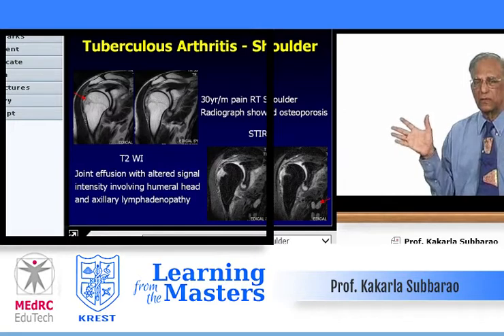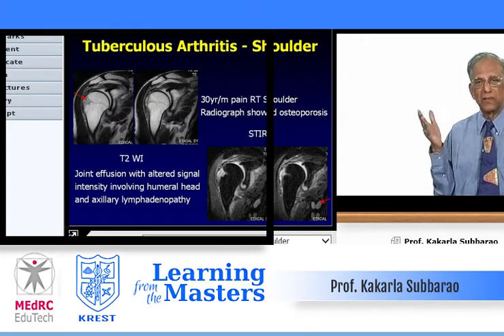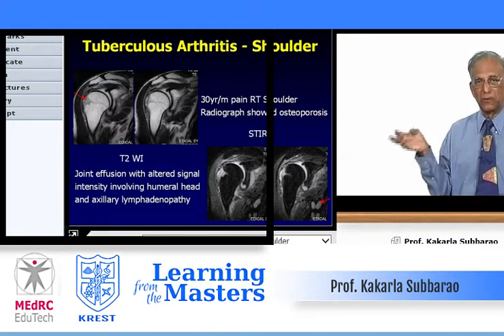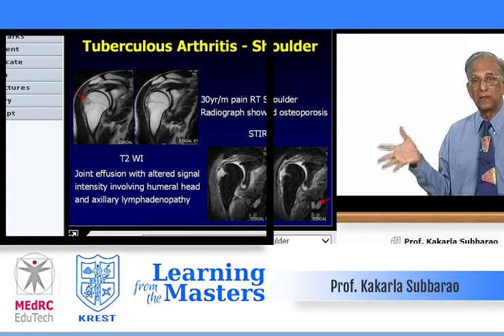Can you diagnose this by ultrasonography? Yes, probably yes, at least suspect. CT doesn't show the nodes, and you can't really identify the effusion. The MRI clearly tells us what is synovial hypertrophy, what is bone erosion, and what is effusion, and in addition, axillary nodes.